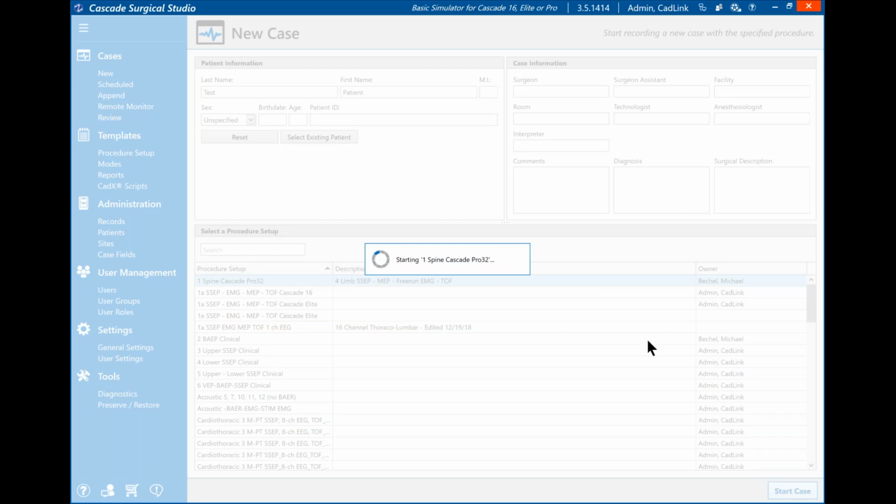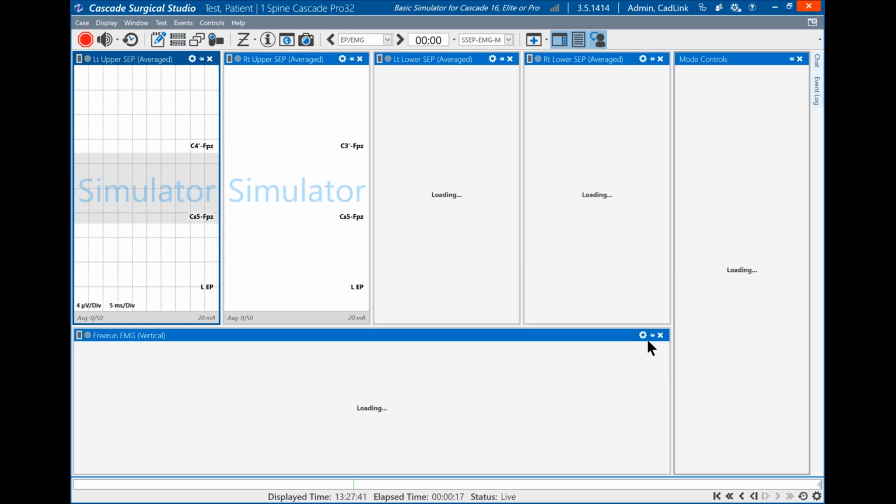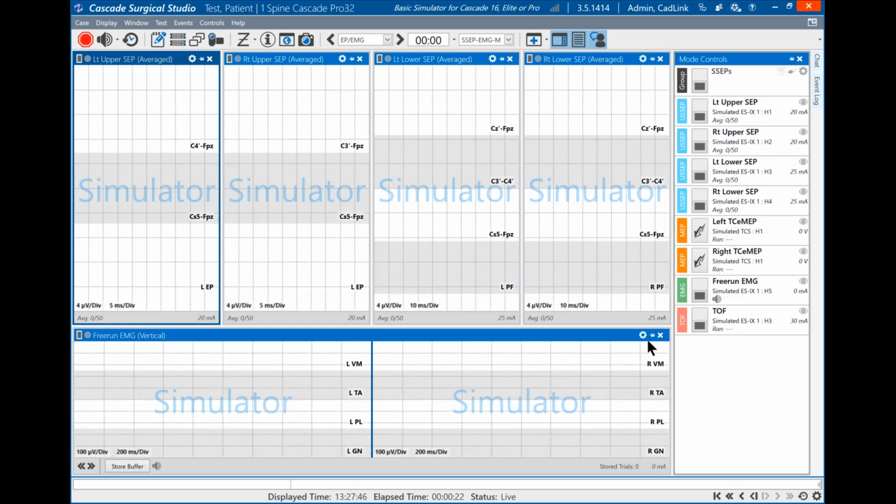It does take a little getting used to, going lower right-hand corner. Just think lower right-hand corner to make your selections. It's a little bit different than in Classic where you tended to go upper left-hand corner, but you'll get used to it very quickly.